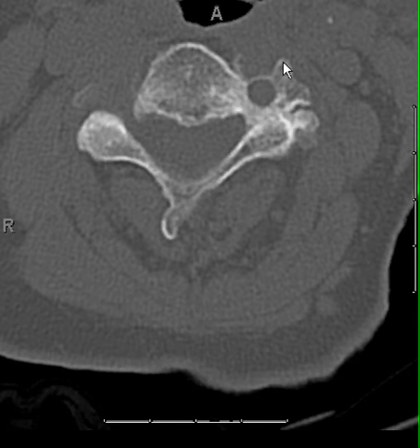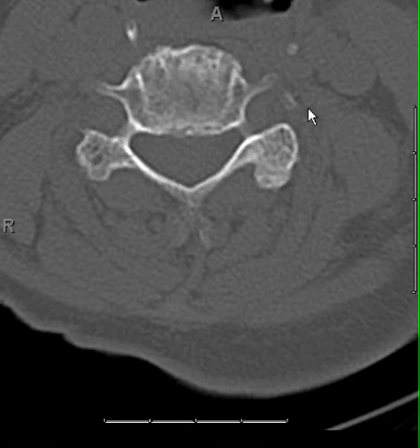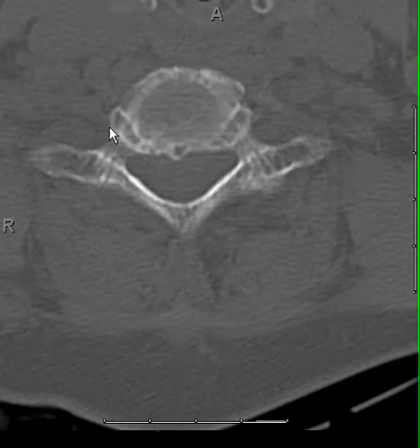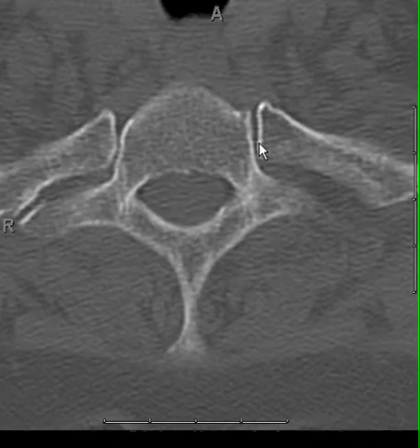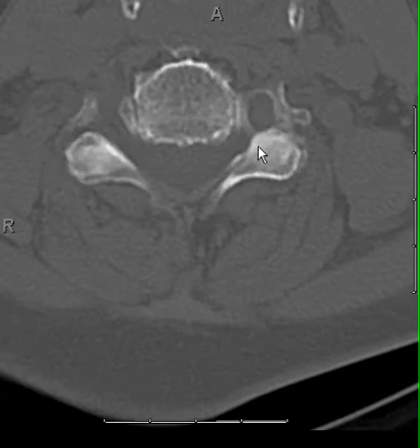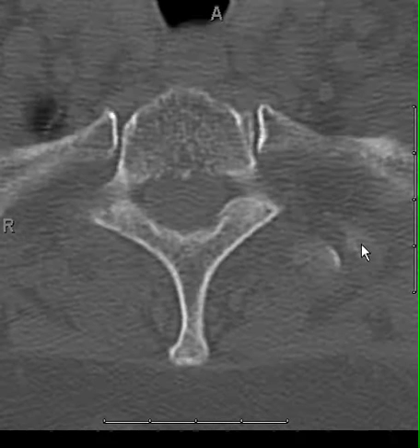So looking at these anterior and posterior tubercles, which are other places that cervical spines get fractured, everything looks pretty good here. We do have some degenerative osteophytic spurring here at the uncinate processes. Not terrible. C7 a lot of times has this little rudimentary transverse foramen, but usually, as everybody knows, the most common place for the vertebral arteries to enter the cervical foramina is at 6, but sometimes they can enter at 5. So now we do get another chance to see these upper ribs, and they look fine.